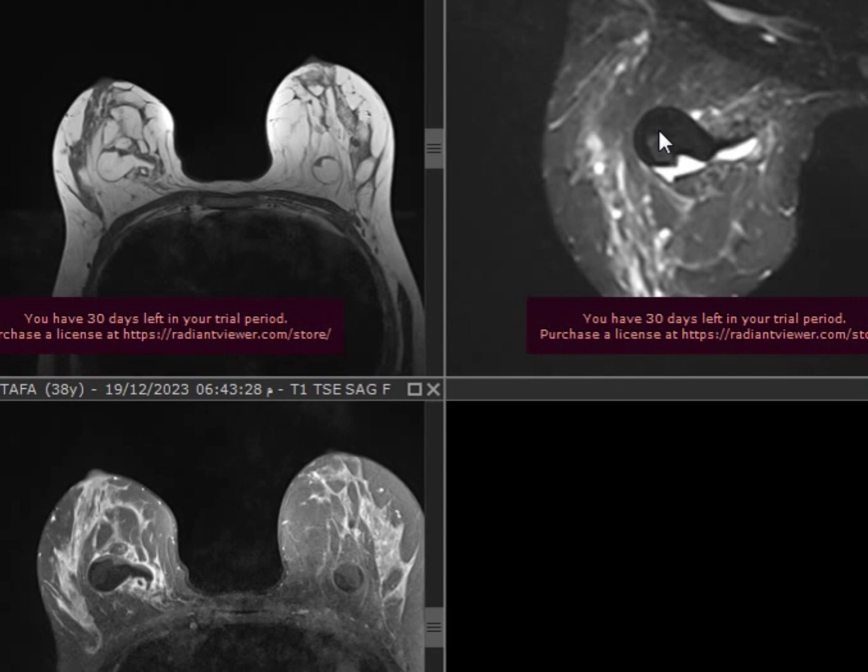I've seen something on the breast ultrasound that I've never seen before. I don't know what it is. Please check it out. So imagine this oil cyst on an ultrasound with fat, fluid, and something inside, multiple and bilateral, and they are big. She has a family history of breast cancer, and she's young, and it was just multiple oil cysts, nothing else.